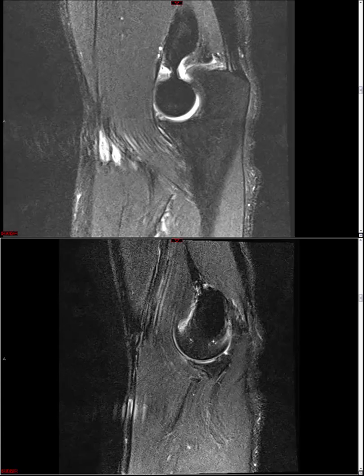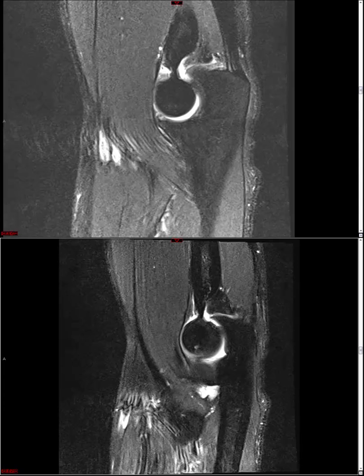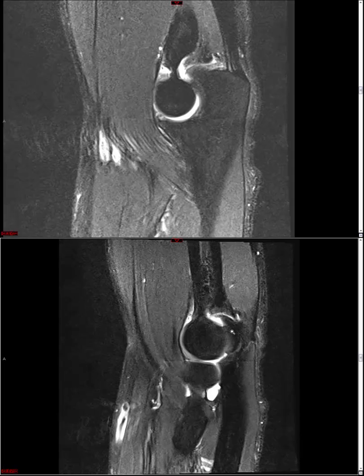When there's joint fluid, as you learned when looking at plain films, you're going to have displacement of these fat pads. So you have displacement of, say, the coronoid fossa fat pad superiorly, you get that so-called sail sign on plain film. And of course, as you know, we should never see the posterior fat pad. If we do, that implies it's been distended by joint fluid, and that's well and good from radiography.